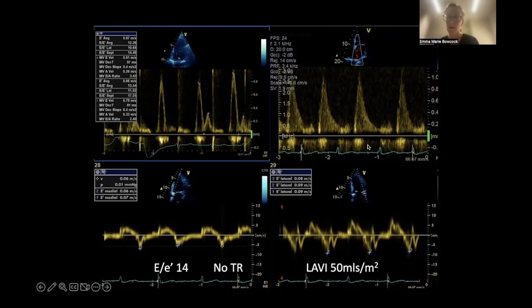But here we have complete systolic blunting, i.e. we have very little or no flow in systole. It's all restrictive in diastole from the pulmonary veins into the left atrium, which, as Ravi was saying, in this context, from what we can see, suggests raised left atrial pressure. So do you want to summarize those 2D findings, Ravi, the things you mentioned that were pertinent, and then combine that with the key features here that allow you to make a conclusion about diastology?